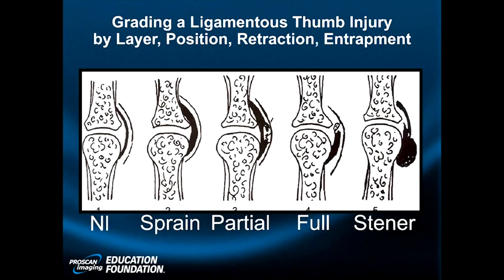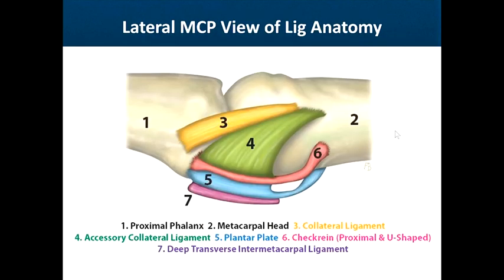In the thumb, you've got a very important ligament, the ulnar collateral ligament, which sits underneath an aponeurosis. It can thicken, it can fray, it can avulse, it can tear and fold backwards and get stuck underneath the aponeurosis, a subject we'll discuss a little bit later.